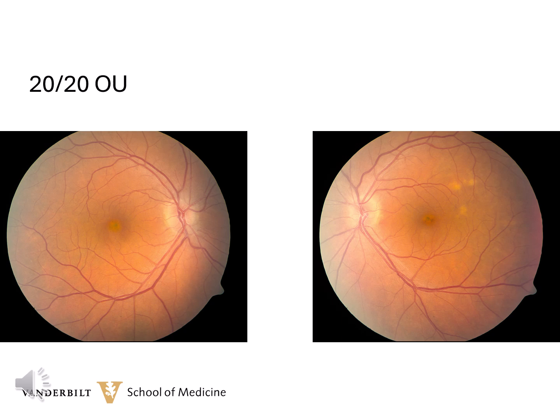This patient has more subtle yellow changes of pattern dystrophy than in the previous patients. If you look very closely, you can also see a little dark center in the fovea. I brought up this example because of the drusenoid changes in the supratemporal macula that you can see in the left eye.